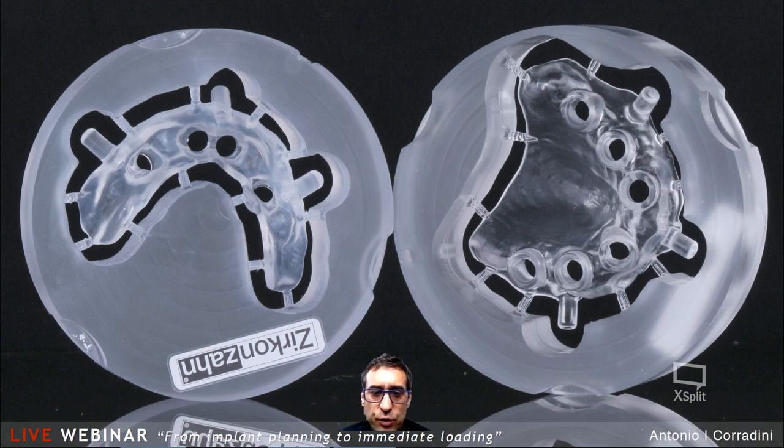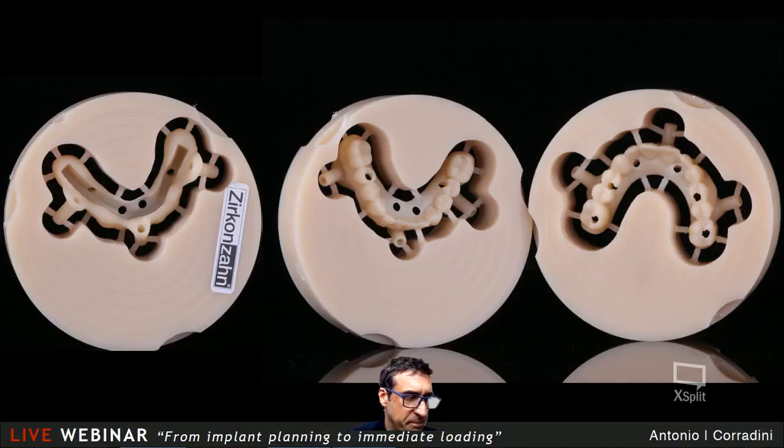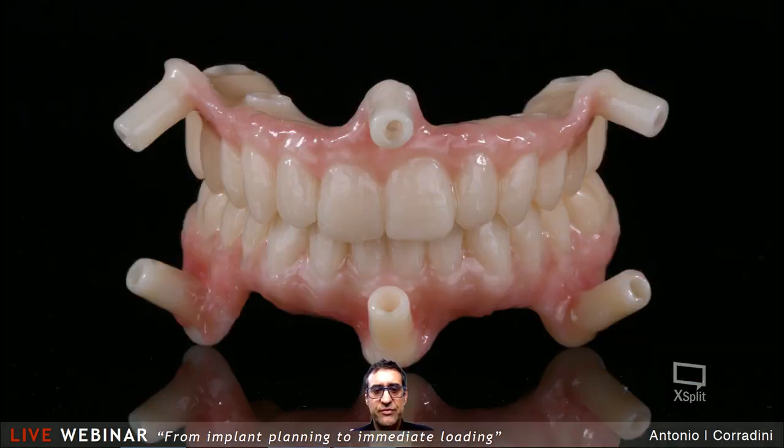Okay, so now I will come back here, and I show you some pictures of the milling surgery guide. You can see, for example, in the prototypes, you can also fit and glue with the position of the pin, like here, so you can fit the prototype directly, exactly in position, in the occlusion correctly. Some dentists would like to have, for example, a reinforcement with a bar in cobalt chrome or something. As you see here on the lower jaw, you can also use that kind of possibility.